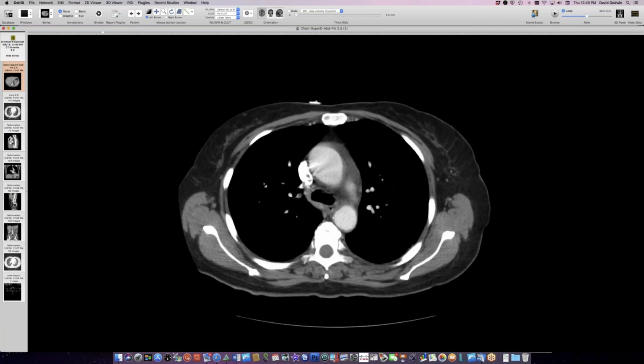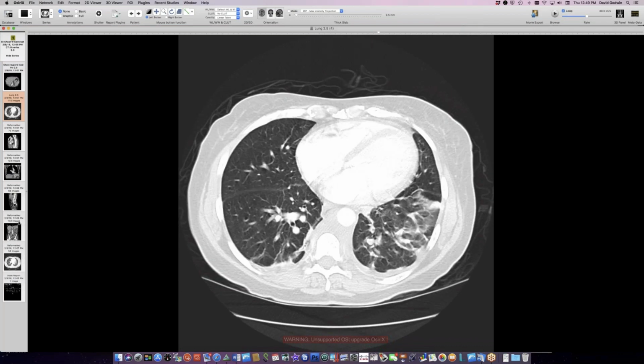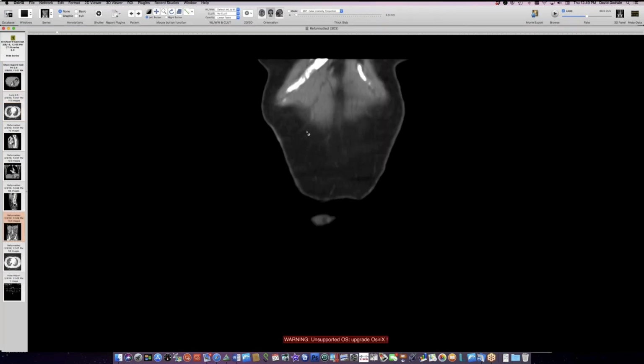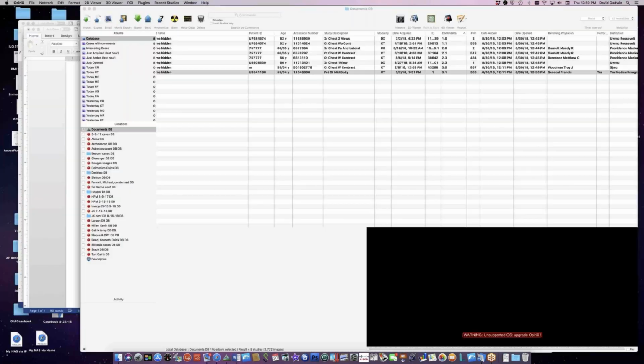And this is outside imaging. The person transferred care to UW, so we got some of the radiographs. There were also, by report, abnormal tibias, fibulas, and femurs with sclerosis, and MRI showing infiltration of something inflammatory in the marrow down there. Not a lot of lung disease here. It all seems to be sort of around the lungs. And let me show you more of the abdomen here, because there was a fair amount of tissue around the descending aorta and on down. So really quite a bit of tissue infiltration here.